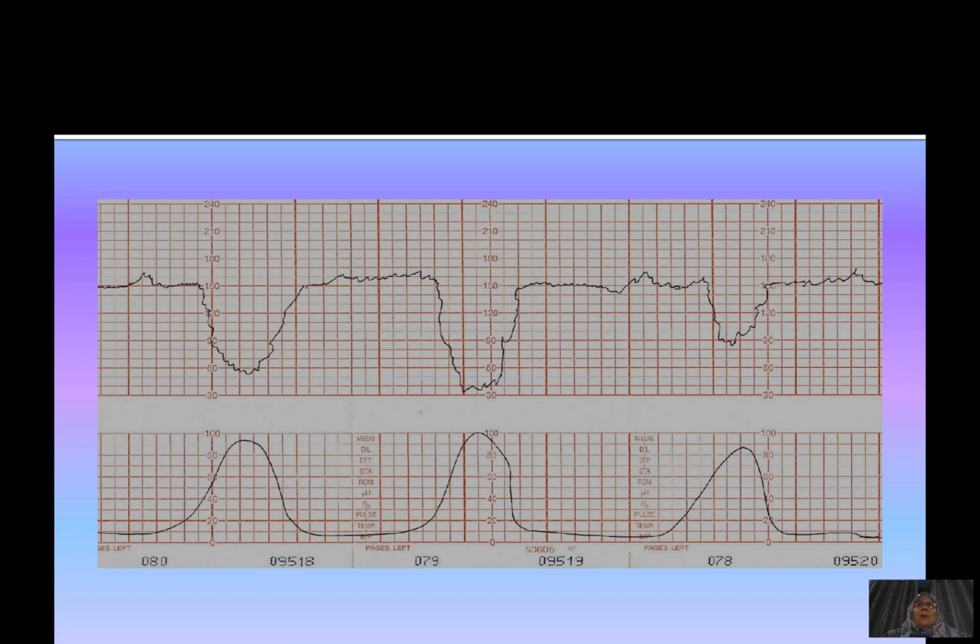And here you can see some prolonged decelerations. Again, you see contractions, 1 contraction every 10 minutes, or 1 to 2 contractions every 10 minutes. With these contractions, you can see that they have long decelerations, lasting about 3 minutes. You can see three squares for these decelerations. The variability is reduced. The baseline rate is around 150. There are these long, prolonged decelerations.